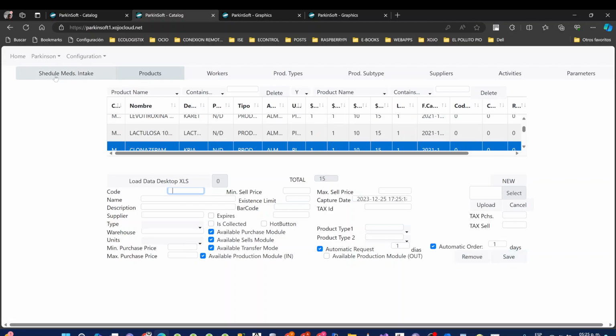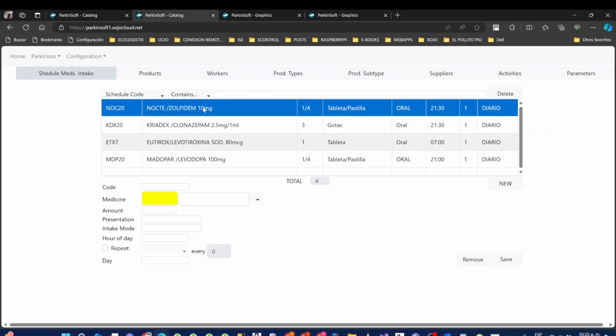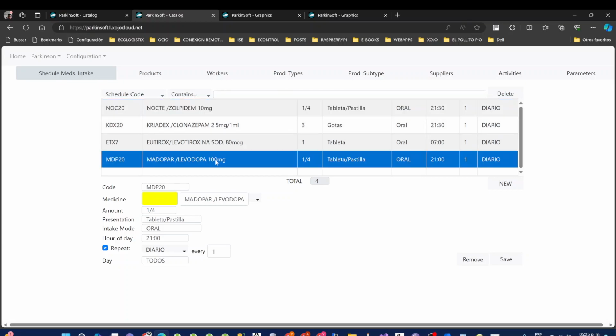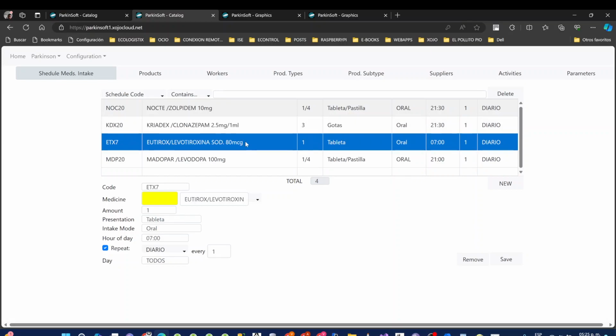Medication consumption and time to take medicine notification. Capturing medications can be done automatically, or manually. Neither of the two guarantees that the patient consumes the medication, therefore, it is important to ensure the consumption of the prescribed medications in a timely manner. If everything is configured correctly, the watch will vibrate and ring displaying a medication consumption notification. The patient must then take the medication displayed in the watch notification and close the notification on the watch.